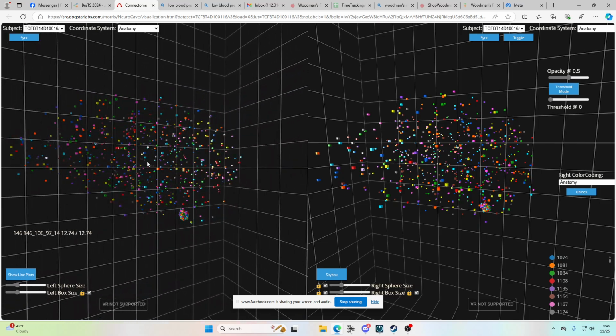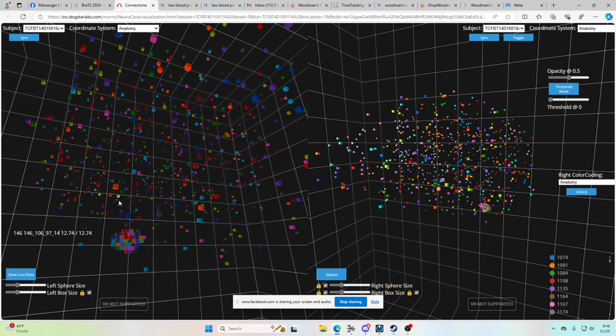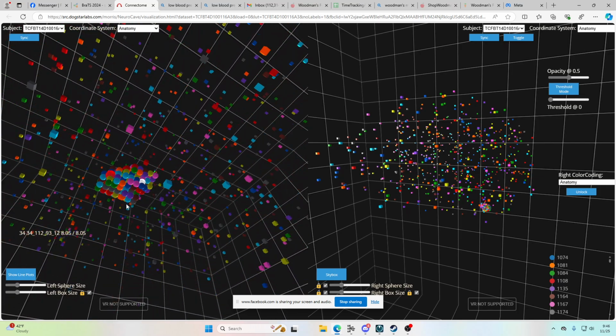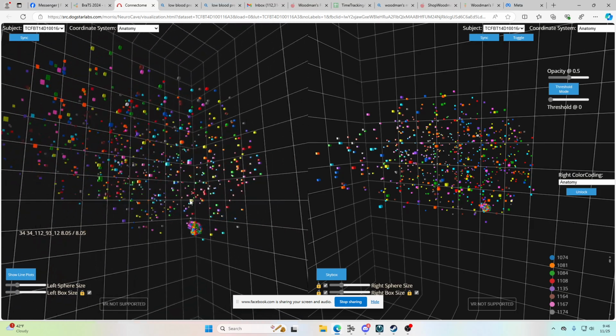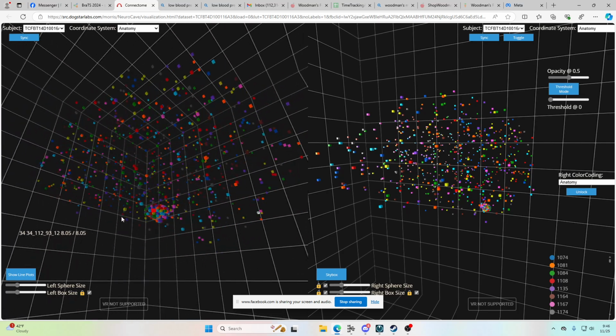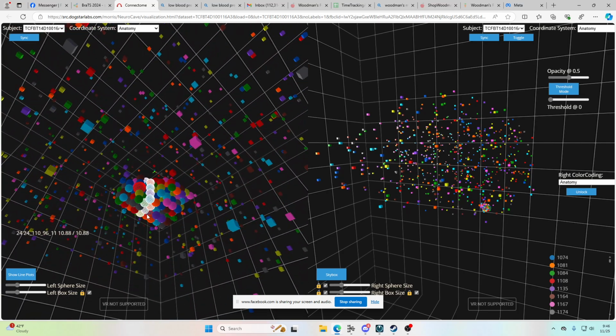So I imported it, and I imported the segmentation. The segmentation is basically just ones and zeros. It's like a 3D matrix, and it has a 0 for regular brain tissue and a 1 for a brain tumor voxel.